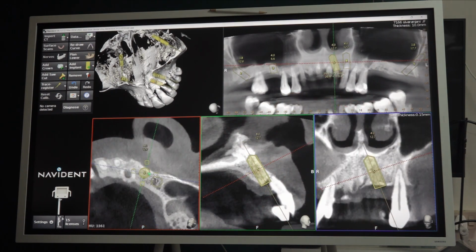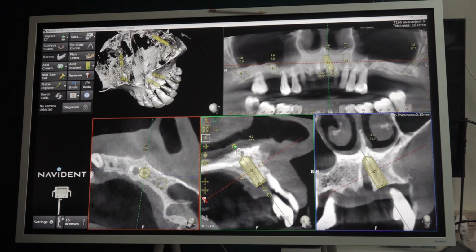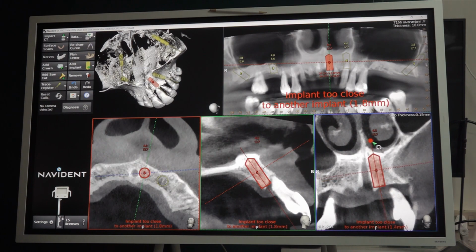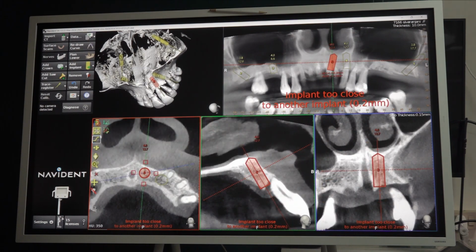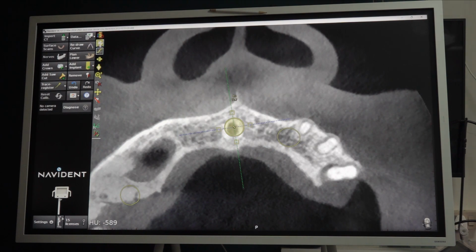So you have to place the implant in the central. If you place the implant in the central, then you may enter the canal, tilting it distally from the center. Yeah, we'll see. See now, this is the canine tip. This is the implant which is coming towards the mesial. Otherwise, we have to place the implant into the canal. That is the only way.